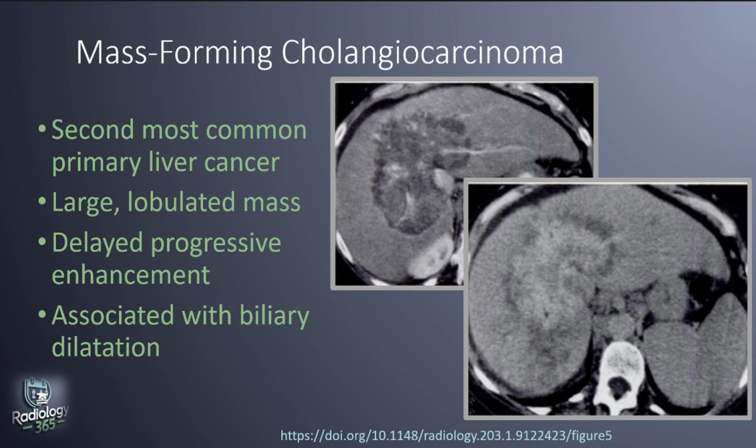So these images show a large peripheral cholangiocarcinoma with heterogeneous, markedly hyperattenuating central enhancement in a 70-year-old woman. The first image is a CT scan obtained in the portal venous phase, and it shows a large, slightly lobulated heterogeneous mass involving the right hepatic lobe and the medial segment of the left hepatic lobe. There is no ductal dilatation here or lobar atrophy. This was a non-specific finding.